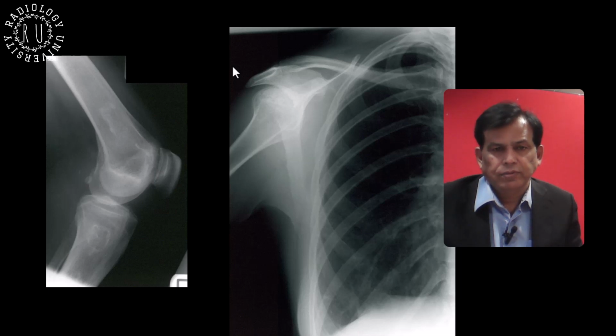I can see a few intramedullary hyperdense sclerotic foci with lucency within.